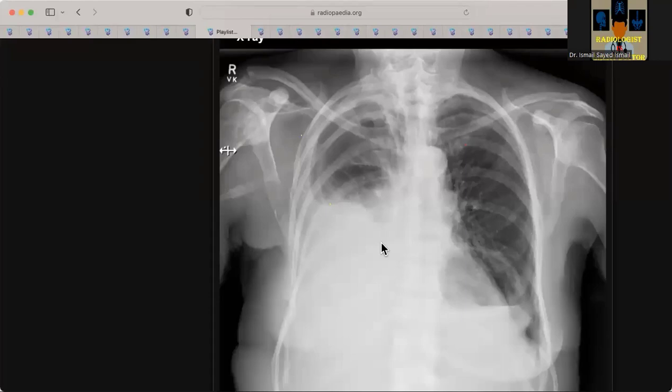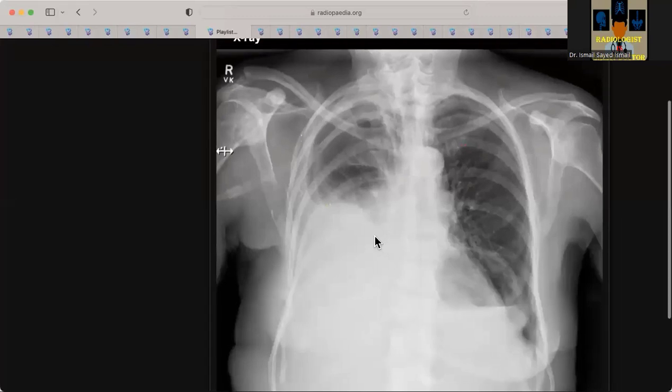No history of trauma. Okay. I can see also that there is fullness at the right hilar area, which obliterates the medial part of the right hemidiaphragm, which could represent a right hilar mass lesion. However, I will ask to see if there are any previous images for comparison, or any lateral images. I also noticed that there is a lytic lesion in the body of the right scapula, in addition to the appearance of the right hilar mass.